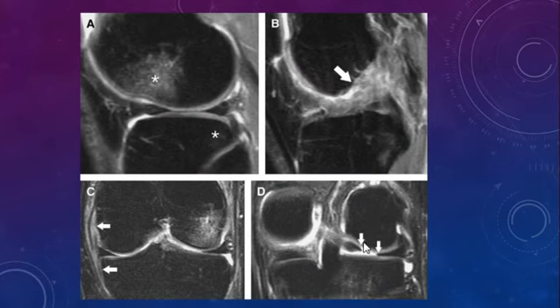You can see here, obviously, the meniscus is torn. The lateral meniscus is torn. You can see the ACL injury here, and you can see here the typical contusion pattern involving the anterior lateral femoral and posterior tibial. Here there is some mild bone marrow edema at the posterior tibial aspect and the articular surface of the lateral femoral condyle. Again, there is incomplete medial collateral ligament injury here.